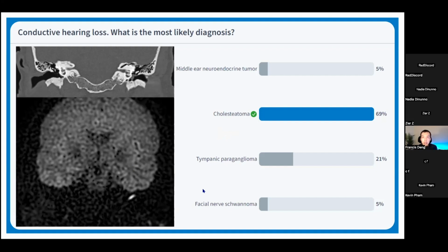or a readout segmented kind of echoplanar technique. All these techniques reduce the distortions in the image that are due to eddy currents when you have a sudden change in the susceptibility of brain tissue and the bone. So non-echoplanar imaging is a go-to technique to visualize cholesteatomas by MRI.